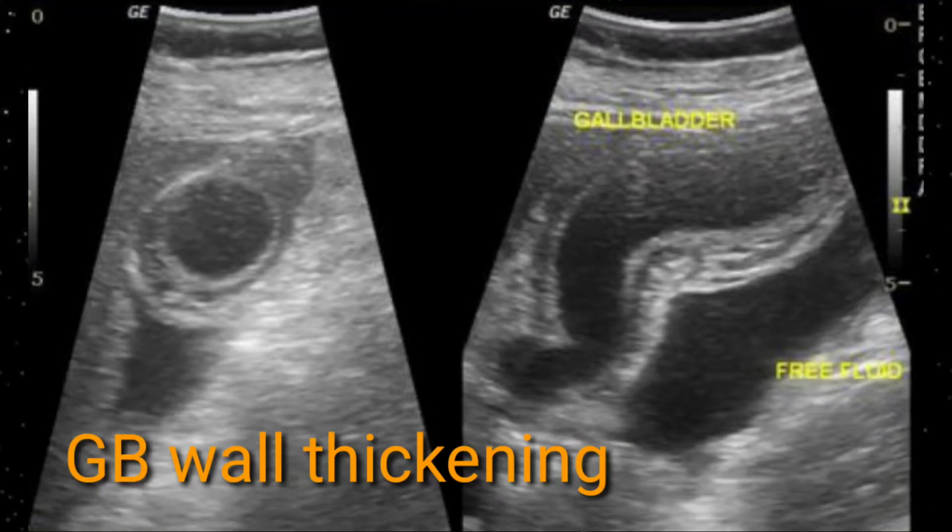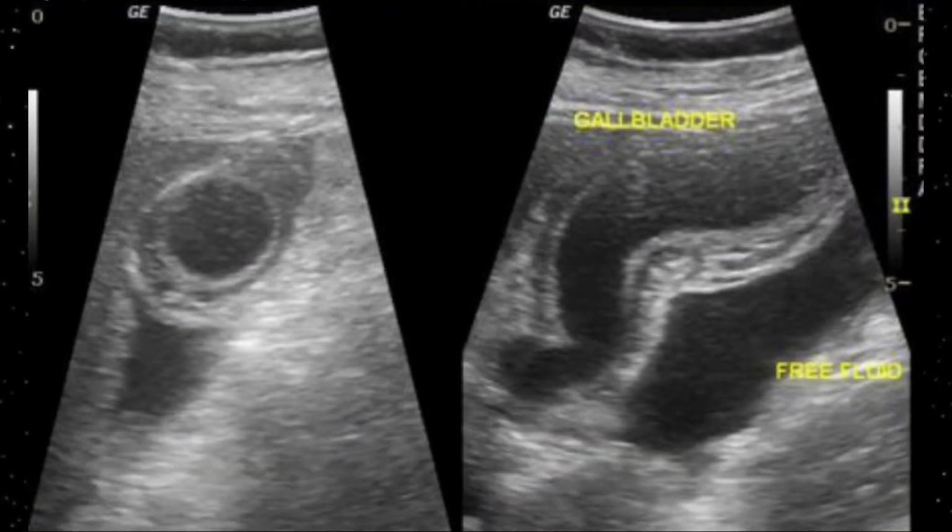Ultrasound findings for chronic hepatitis would include coarse parenchyma of the liver with irregular wall, splenomegaly, thickened gallbladder wall with edema, and ascites as well. Development of ascites depends upon the stage of the liver disease. If it is end stage disease, there would be marked ascites.